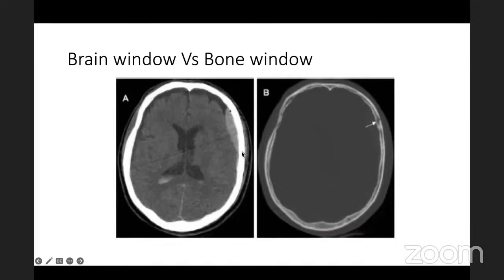So this is because of calcium in the bone. And you can see that there is a small black dot here, which resembles the air which is outside. So I'll use the pointer to show this. If this is the blood here, this is also blood, and this is the bone. You see a small point of air, but you don't know where the air has come from.